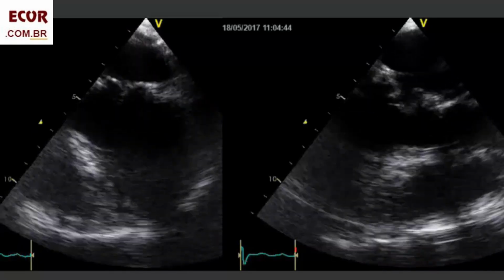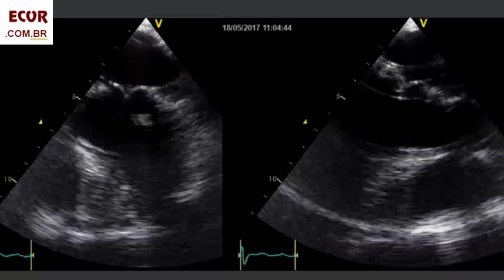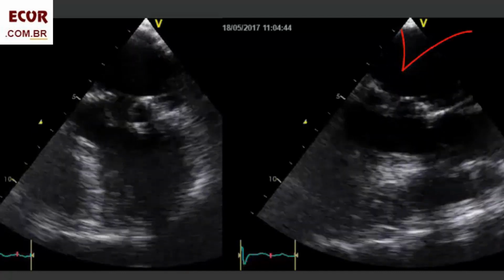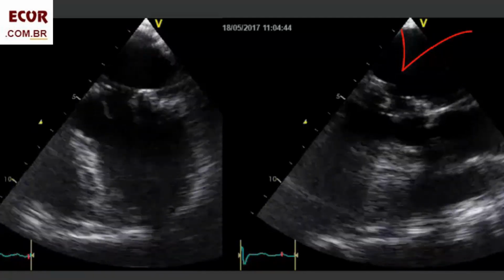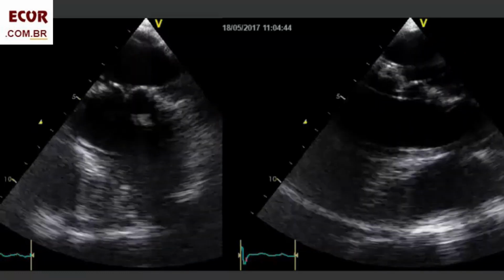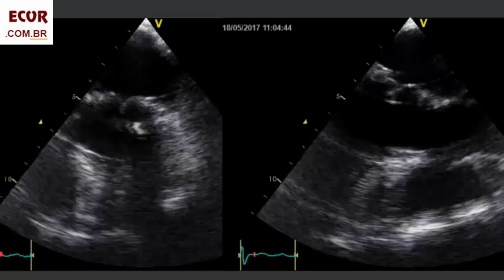One of the leaflets is fixed and the other two move just the distal region. The denser feature that thickens the proximal leaflets comes from the sewing ring and is a Pannus.